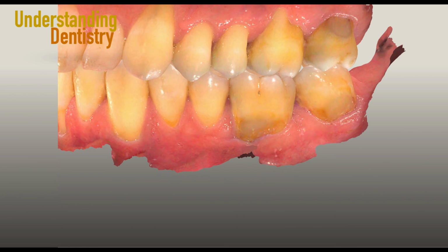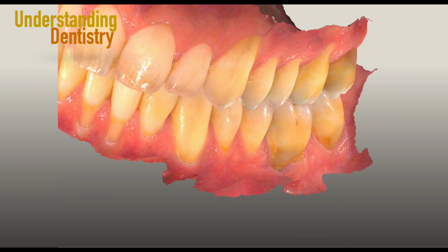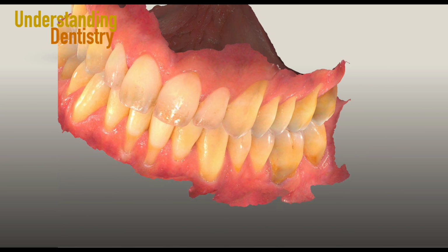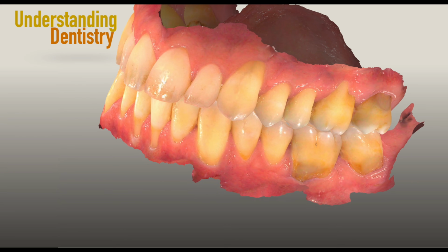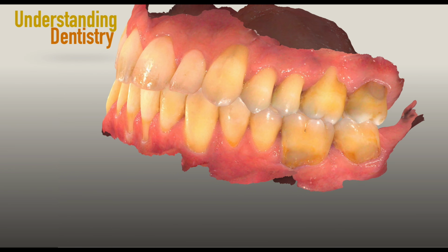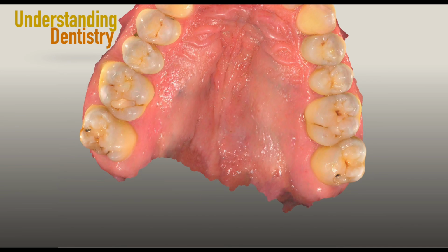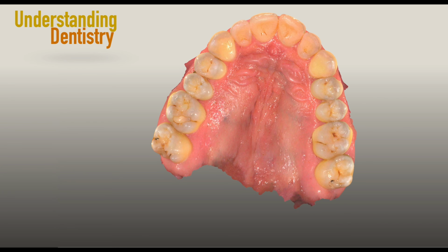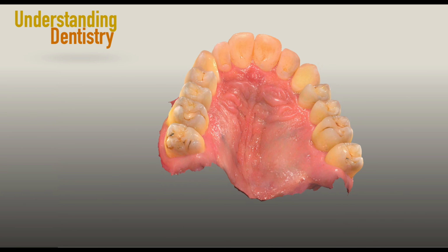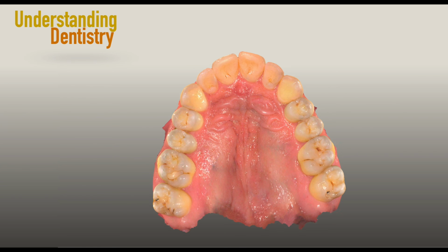Now we can see this properly on the real patient with the intraoral scans, all those differences between the teeth that we are talking about. We can see gingival recession, including those cervical restorations in the lower 6 and the upper 7 of the left side. Even the lower 7 has a cervical resin restoration. We can see that. Please also realize that the buccal tips and the incisal edges are more translucent as compared to the cervical areas of the teeth.